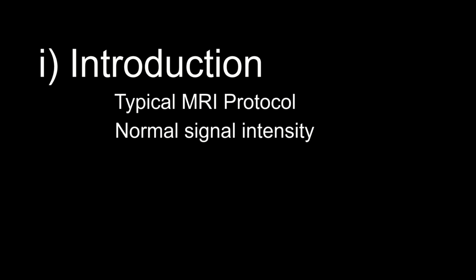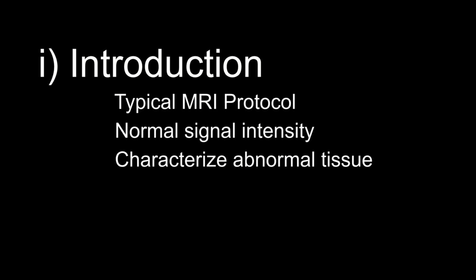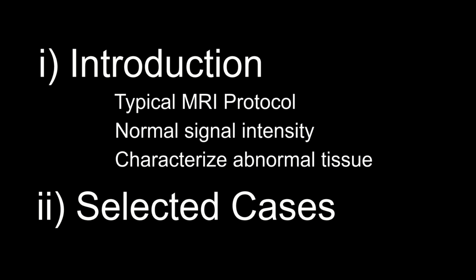The structure of this course is as follows. This first video will cover some necessary introductory material, including typical sequences in a routine MRI pelvis protocol, normal organ signal intensity, and how to characterize abnormal tissue that you'll commonly encounter on MRI.